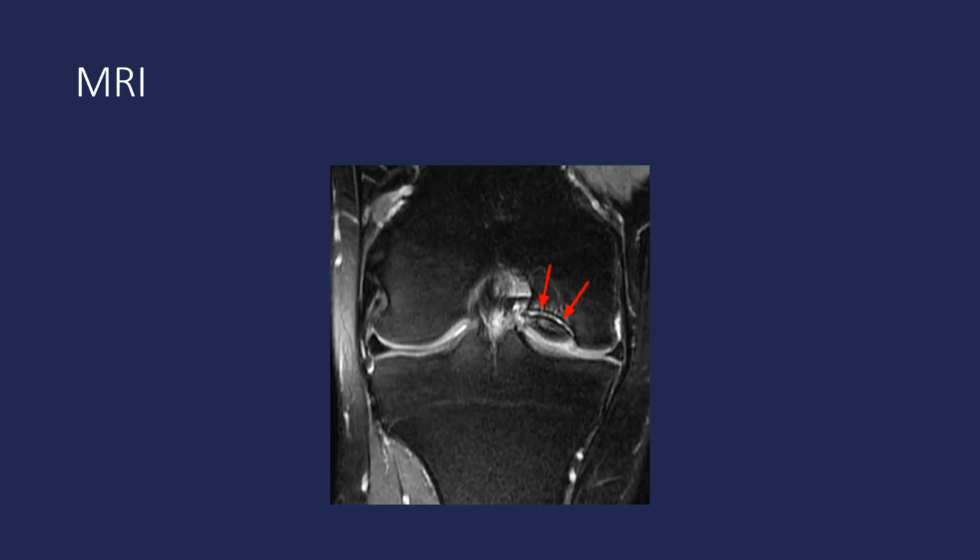This is a medial femoral condyle OC lesion in a 19-year-old male that was deemed to be unstable. Notice how the T2 weighted image allows us to visualize the edema around the fragment that has begun to migrate away from the medial femoral condyle, resulting in the determination that this is an unstable lesion.